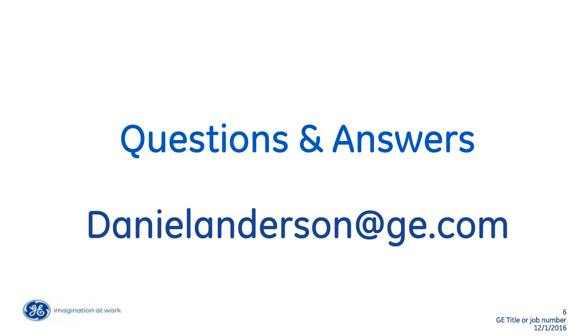Okay, so Pavel has asked if there's any differences between DaTQuant standalone and the version I've just shown you. I believe not, Pavel. I think they're exactly the same. That's my understanding of it, including the reconstruction part at the beginning. So yeah, the two platforms are aligned.